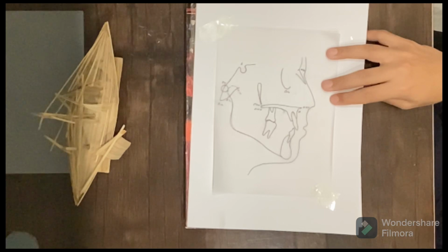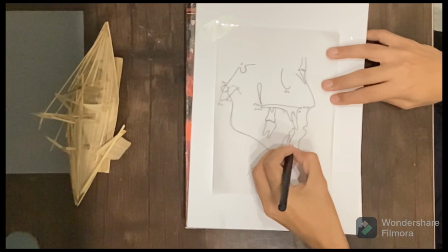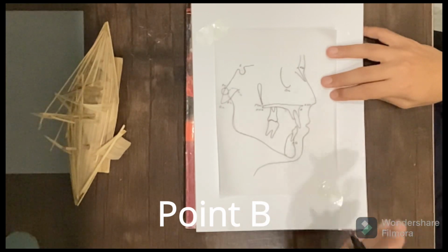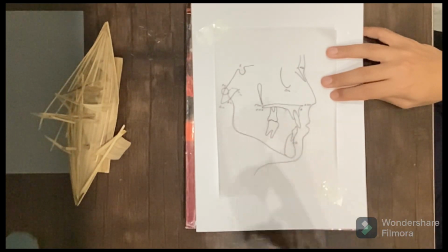Now coming to the mandible. The mandible has unilateral points as well as bilateral points. The first point is point B, which is the deepest point of the labial cortical plate of the mandible of the most anteriorly placed incisor. So this point marks point B.